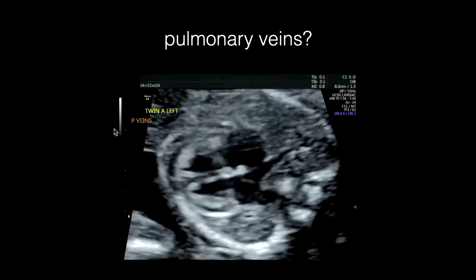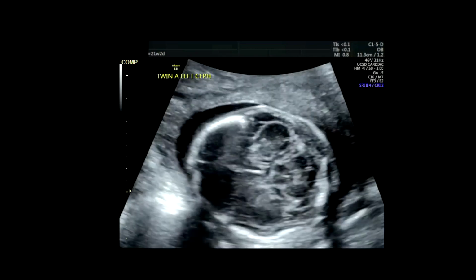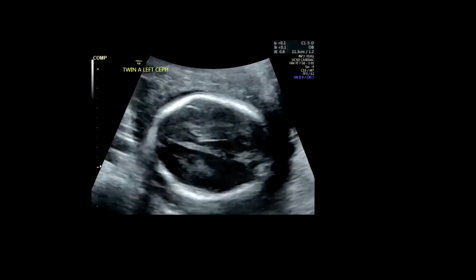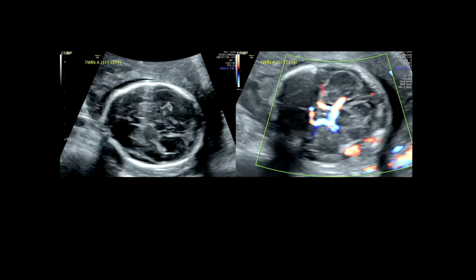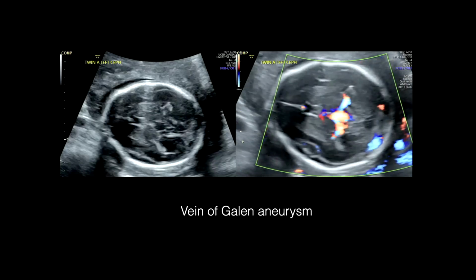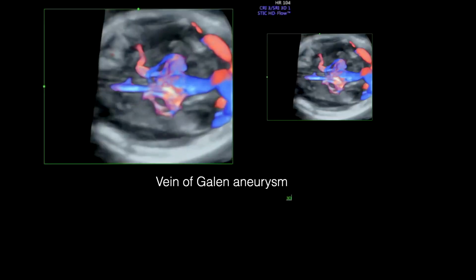So in this particular case, this was a very astute sonographer who knew to then go up to the brain, right? Because the extra flow needs to be coming from somewhere. And you can see that the grayscale imaging does not reveal our diagnosis there. You need to put on the color Doppler. And here we could see that this was a vein of Galen aneurysm. And we can see showing the drainage there. And then a nice 3D picture just didn't help us in the diagnosis, but did make a pretty picture.